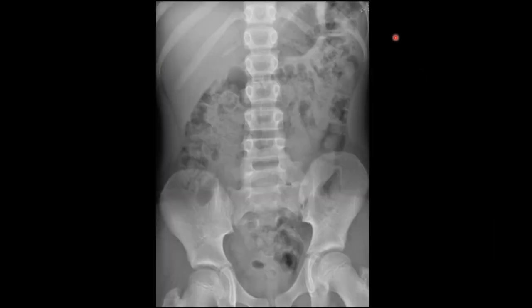So this is a typical abdomen X-ray. Now, sometimes you might not get the base of the lungs on there. Typically, if not, then they should do 2 landscape X-rays rather than 1 portrait. It doesn't always happen in practice, but you want to be able to see the inguinal orifices up to the base of the lungs, ideally. So really, we probably should have done 2 landscape for this, but anyway, it doesn't matter.